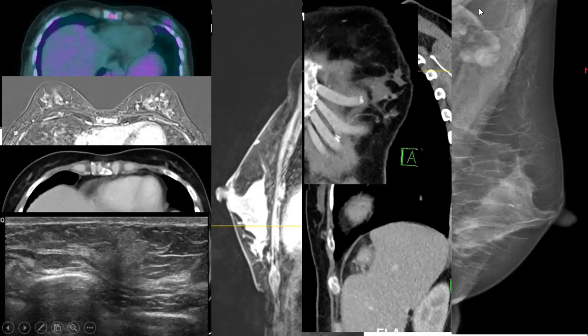This is a metastatic lymph node still having abundant fatty hilum because the metastatic deposits were in the cortex, not yet growing, okay, to obscure or infiltrate the fatty hilum.